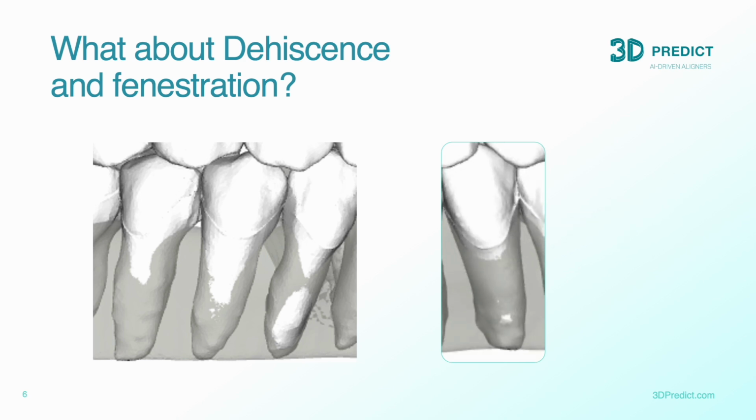The bone recession is approximately 1 millimeter in just one tooth. This seems much more reasonable, and I will feel comfortable proceeding with this treatment plan. Regardless, this is your decision as the clinician, but it is important to set expectations.